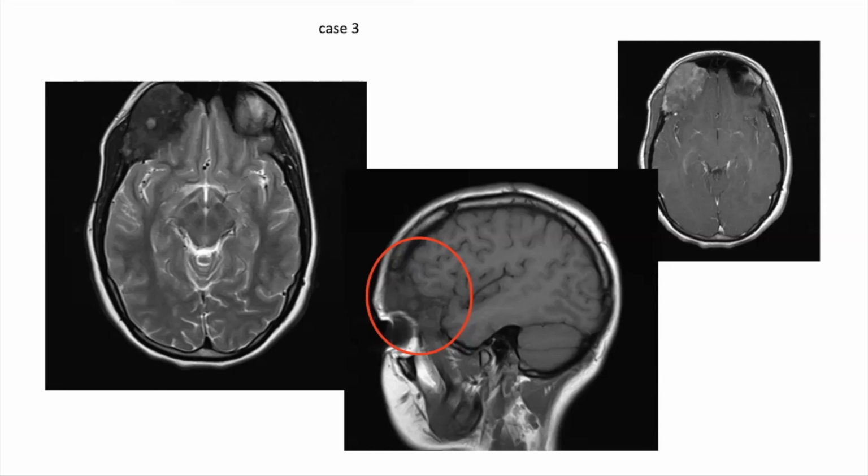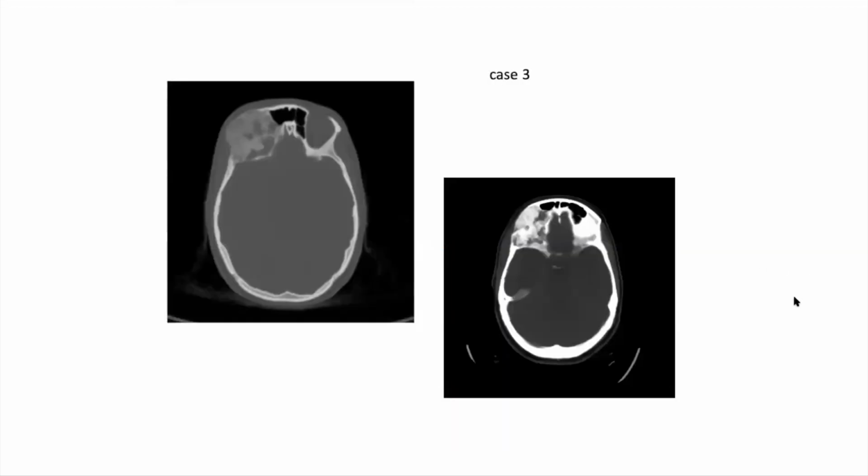Of course, now you're going to say, well, I'd really like to see the CT scan. And so here's the CT scan. Here it is on the bone window or bone filtered image. Here's a different level, again, showing you the same lesion. So let's see what you think of this one. Do you think this is fibrous dysplasia, an intraosseous meningioma, lymphoma, or metastatic disease?